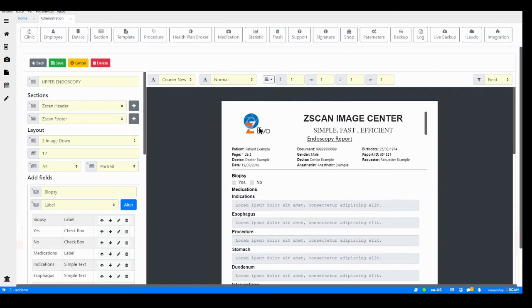So moving to this other part here, I'm showing you can control and customize the fonts you are using on your report. Okay, so bear in mind here on your right side, apply to, you can choose the changes to be applied to a field or to a label. So if I want to have my labels in a different font type, I just choose the font type here.